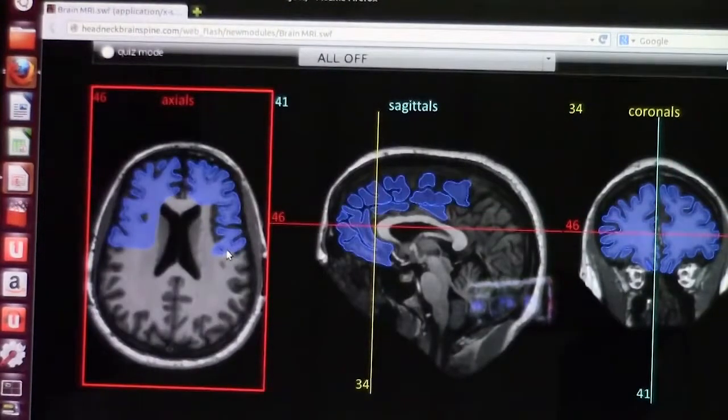This would conclude the first part of our series of how to read the brain MRI. It is really important to read MRIs and get used to knowing the MRI cuts and the structures, as you need to know first what structure you are looking at.